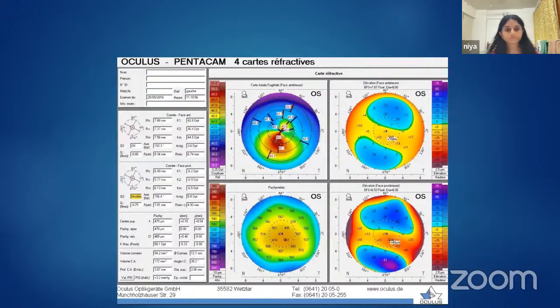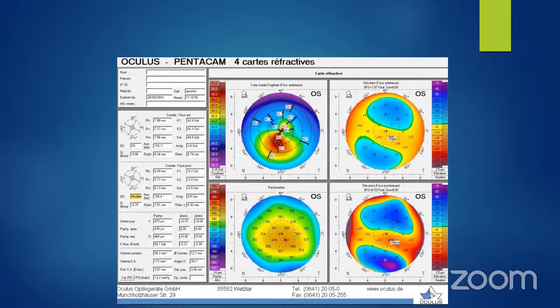So now, any one of you, please, just describe this. Only one or two will describe. Then we'll just go, okay, what is this? Which way do you want? Do you want to describe or just want to say what is the diagnosis? Spotters. Let's go fast so that the postgraduate can present their case also. Spotter, what is this? And at least 2 points to say why you are saying that, not just a wild guess.